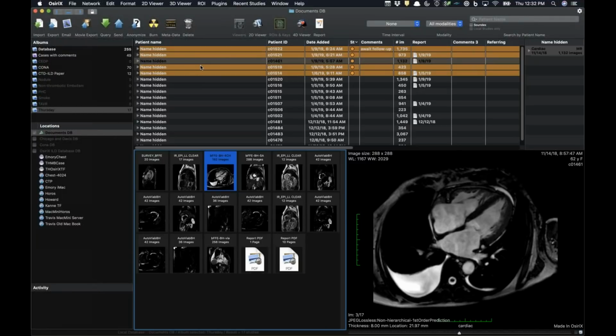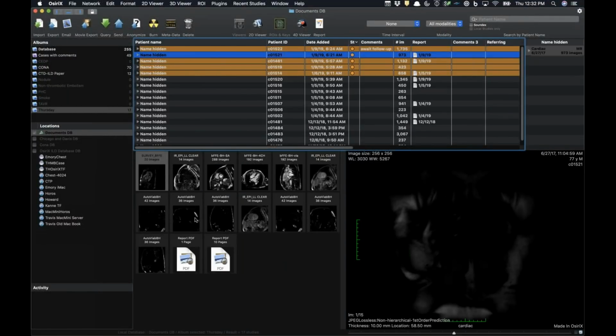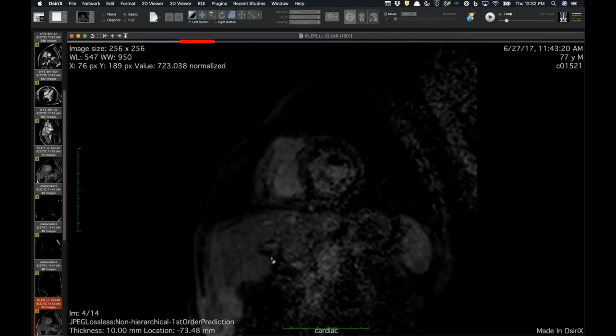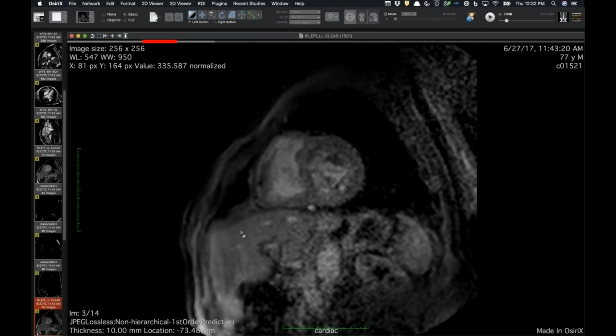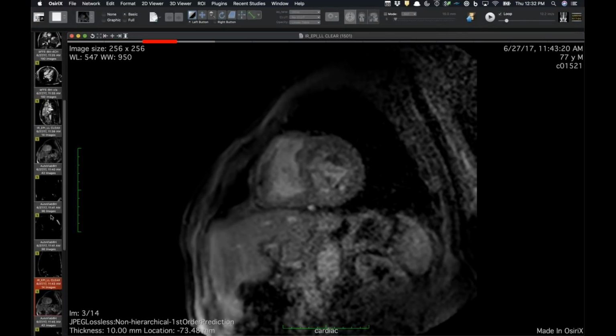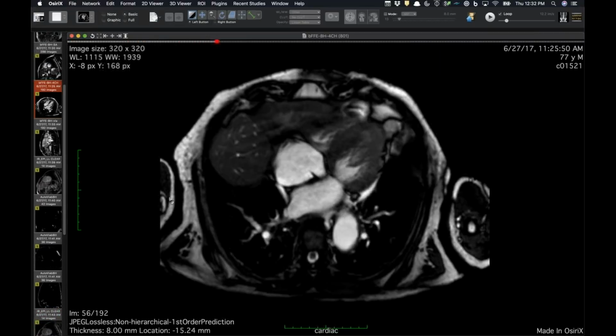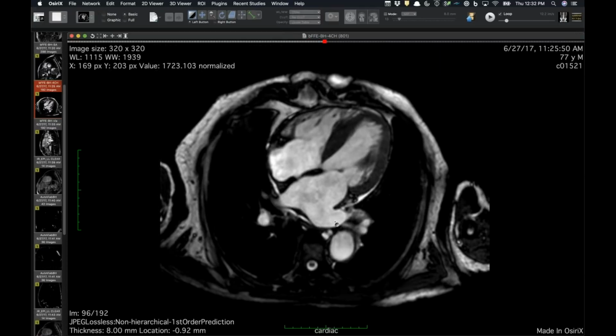One of the things that confused me for a while, but now we've seen more cases and there's more literature differentiating this, is distinguishing AL or light chain amyloid from ATTR or transthyretin amyloid. There's some cardiac literature, I'll show you a paper, that shows you can distinguish fairly reliably based on the enhancement patterns. But we always think about the typical delayed subendocardial enhancement.